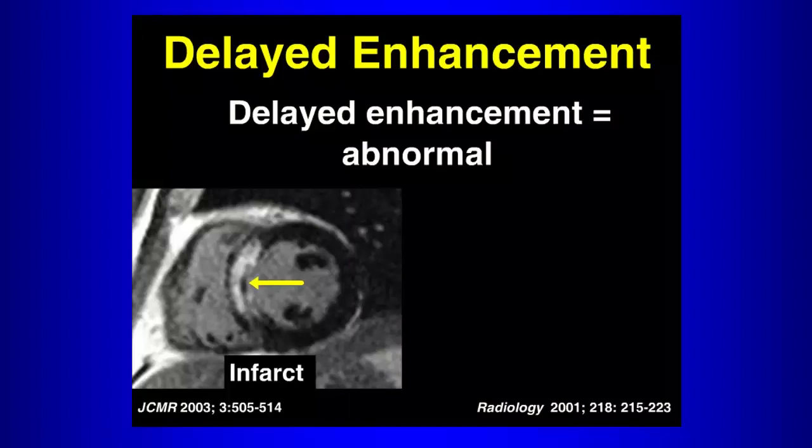Microvascular obstruction, right? What does that tell you about the infarct? It's acute, right? So if you have this finding associated with infarct, that tells you that the infarct is acute. So that's a region of microvascular obstruction. What happens over time is it converts to scar. So 5 months later, that will go away and the whole thing will enhance.